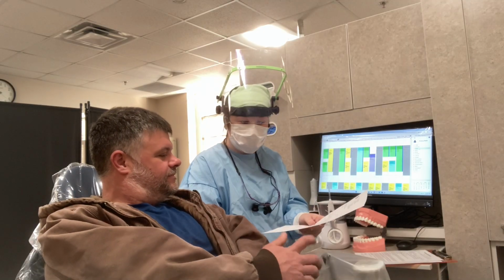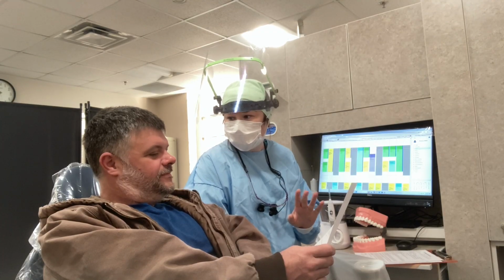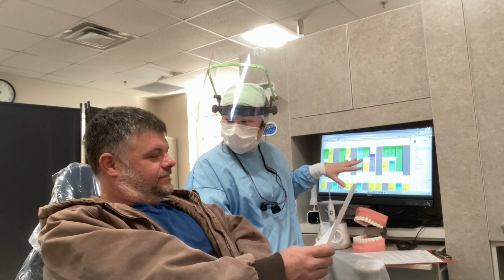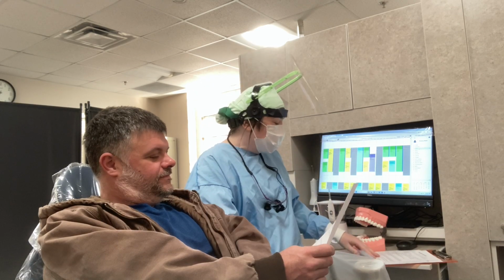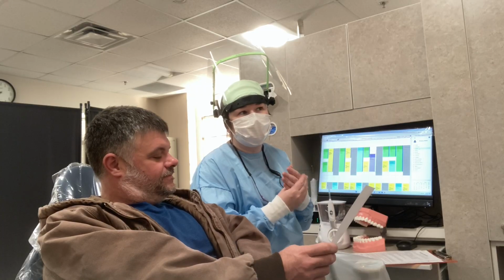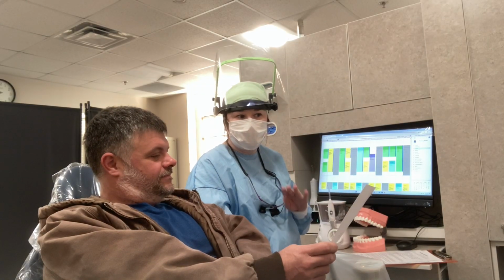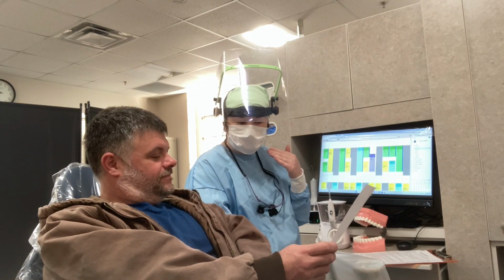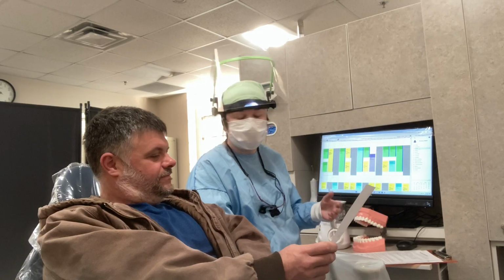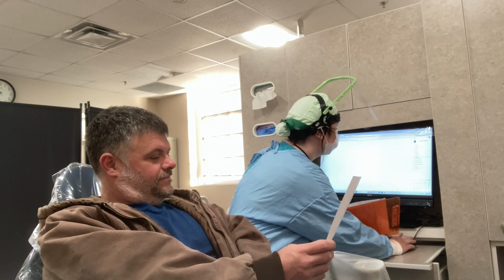You'll actually get to take that home with you today. And really the main thing that he discovered was mild gum loss. We also went over that when we went over your perio information, when we were measuring your gum health. Do you remember us doing that? Okay. So when I called out the 1s, 2s, and 3s, those were all positive numbers that indicated that you would have healthy areas of bone. But when we had 4s, 5s, 6s, that's where we had some disease or inflammation. So I'm going to pull that up really quick, just so we can review that.